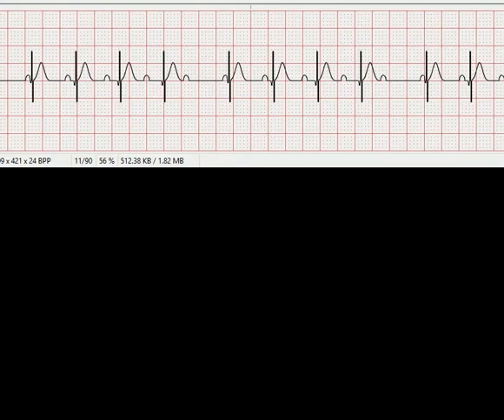Alright, here's our second example. Go ahead, pause the video and walk your way through the steps and come back when you're ready.